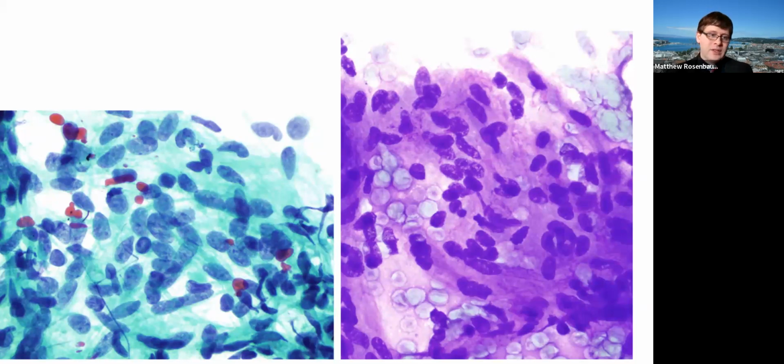They don't really have obvious clear cell borders. They do have faint nucleoli, which aren't that horrible looking. The nuclei are very homogeneous and elongated, as you see in spindle cell ones. It's, like I said, very densely cellular. You don't see obvious anaplasia. You don't see obvious mitotic figures.